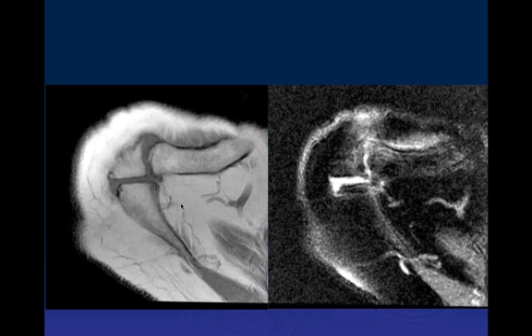They may or may not be associated with impingement, but what can happen in a case like this, we see a lot of fluid in the joint space. This pseudo-articulation can become loose, in which case there can be a lot of movement of the acromion process here, and that can actually lead to increased risk for impingement due to the os acromiale.